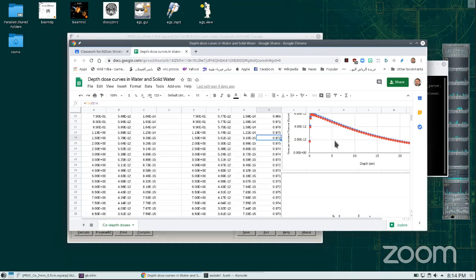One thing we have to be careful of is that planning systems report doses to water. They don't report doses to medium of bone. This is also another project, and that is doable by the dose XYZ, which I will show you how to do. For example, in that heterogeneity phantom, the bone in the treatment planning system uses water because it's based on CT numbers.